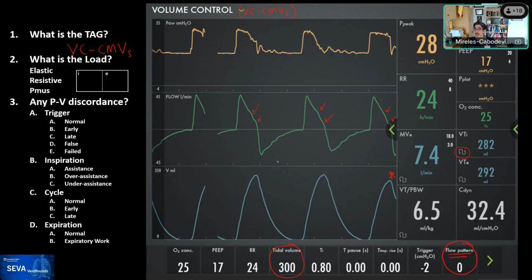Excellent. So now that you know that, Rob has helped us disclose that there was PMUS during the inspiration. So now that you know that, Simran, why do you think the volume is a little bit lower where the asterisk is? Or it's not only Simran, any hypothesis here from the team? Was there a change in something in the circuit that affected the sensor? Because there's no more PMUS. Now this is the actual volume that the ventilator was delivering.